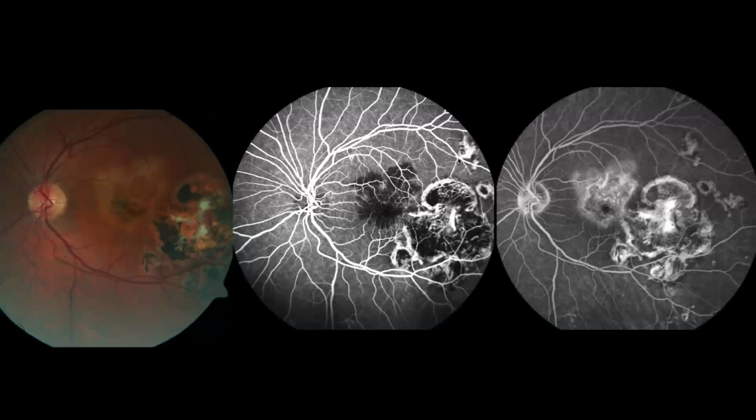Okay. So here you have an active lesion. And then here you have an old lesion. Okay. So this is a case of macular serpiginous chororetinitis. So yeah, kitang-kita on FA. But if you just take a look at the photo, of course you take note here that there's parang fuzzy, parang indistinct borders that sort of tells you that this is an active lesion.